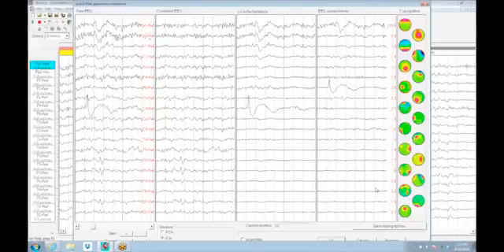And as such, the non-Gaussian nature of the artifact allows the ICA to be particularly well adapted to it. And it's pulling out these non-Gaussian components very nicely as isolated pieces.